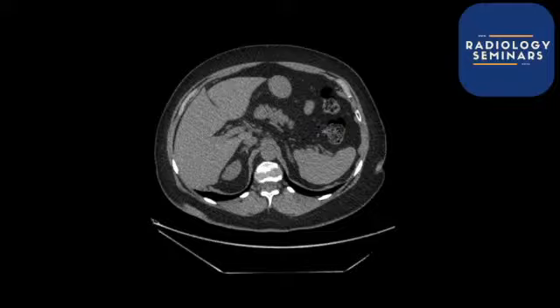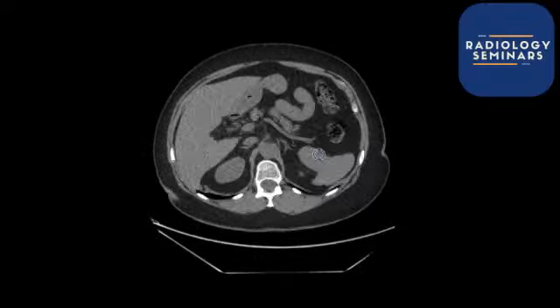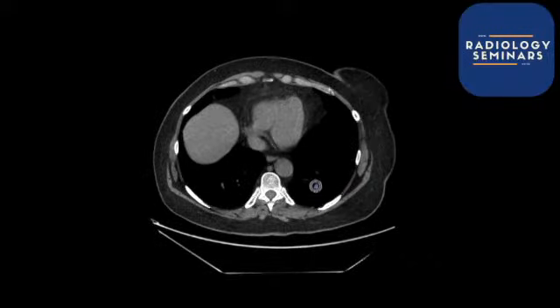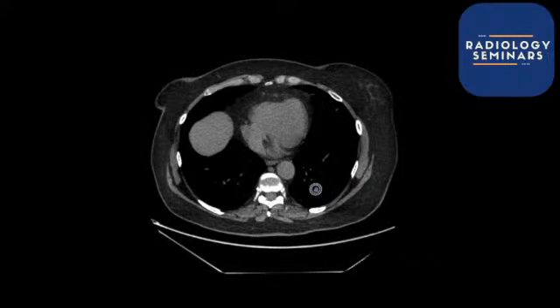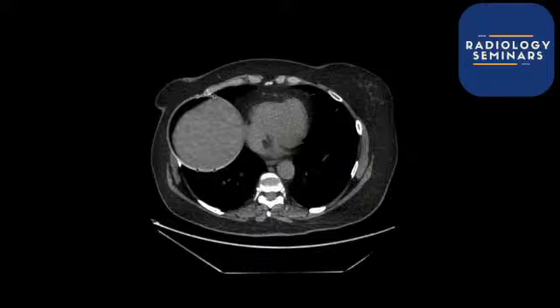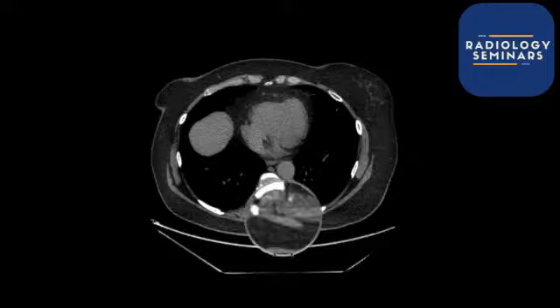Right, without much further ado, I'm going to make this a bit of a quick one because I do need to rush. So this is an acute abdomen, as always, and you might have noticed that this particular acute abdomen looks slightly different from the other acute abdomens that we've been looking at over the last few weeks. Now when you look at this, where is the contrast? That aorta looks the same density as the liver that's over there and doesn't look too different from the musculature which is sitting over here.